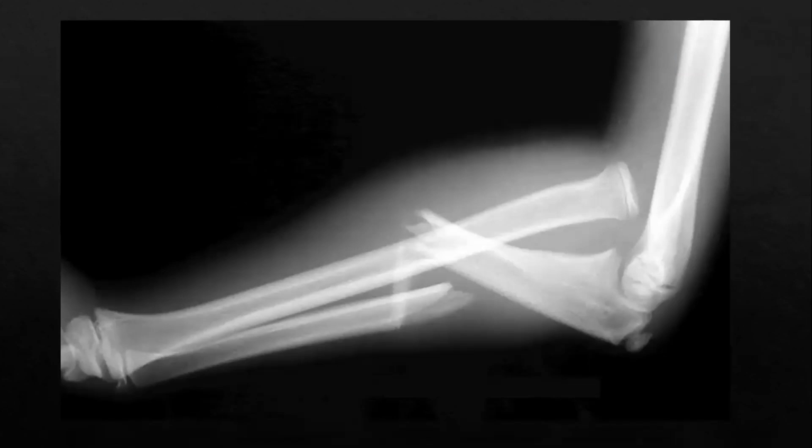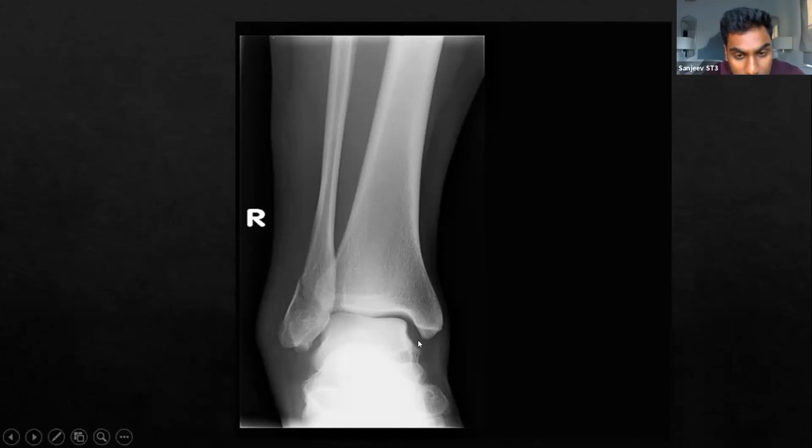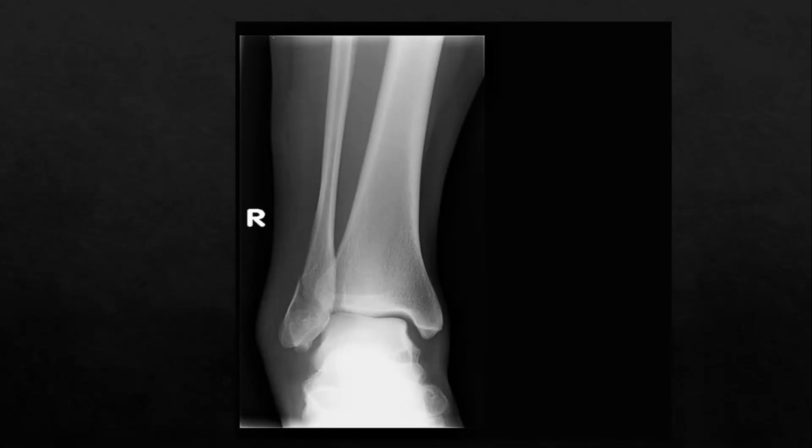Yeah, go for it. It's just Maz is asking, how do we work out the Mortise from an AP view in something like this? What do you mean by that, Maz? Do you want to just unmute yourself, if you're able to? Just ignore the background music, but for me it looks quite similar. Is there some sort of way to work out whether this is, because I know they do the angle of the foot, it's like dorsiflexion and all of that. How do we work out which is which? Oh, I see. Are you asking how do you work out whether it's a Mortise view or not? Yeah, how to work out if it's AP or Mortise view.